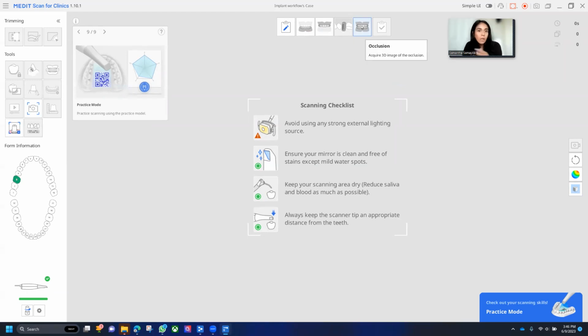So what is a scan body? A scan body is an intraoral implant positioning transfer device. What we're used to doing is taking traditional impressions with coping and then shipping the bits and pieces with the impressions in a box to our lab. At this point, all you're going to need is a scan body. And where do we get the scan bodies?